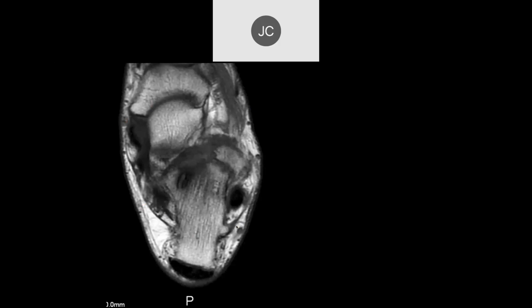Tayson, what do you think's going on here? Never mind. Let me just show this. And this just shows you what sometimes people will call a peroneal tubercle. Notice it's posterior to the peroneus longus tendon in this location, and here's that ligament attached to it, the retrotrochlear eminence.